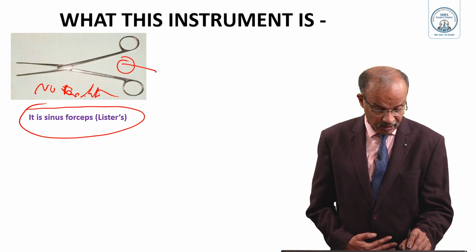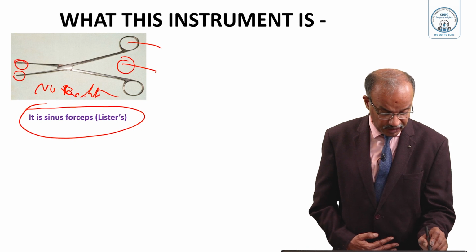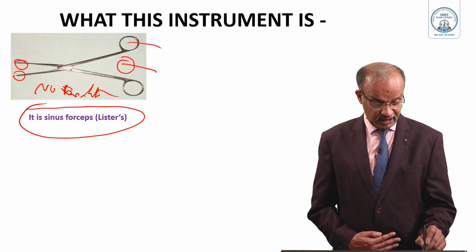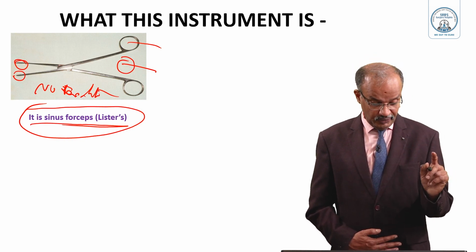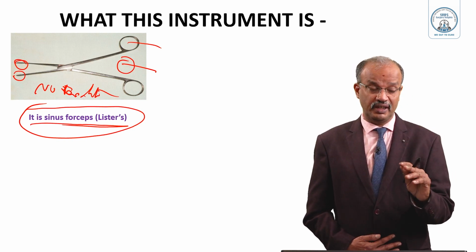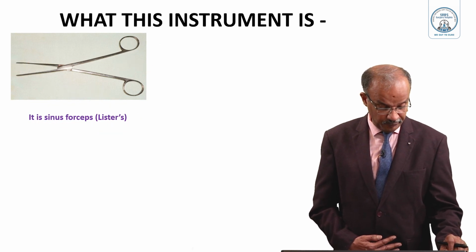No lock, finger bows are there. In the distal blade, there are small serrations, at the tip only. Lister's sinus forceps, remember. Lister is the father of aseptic surgery. So asepsis in surgery he actually started. So there is no lock, that's the point you have to always remember.